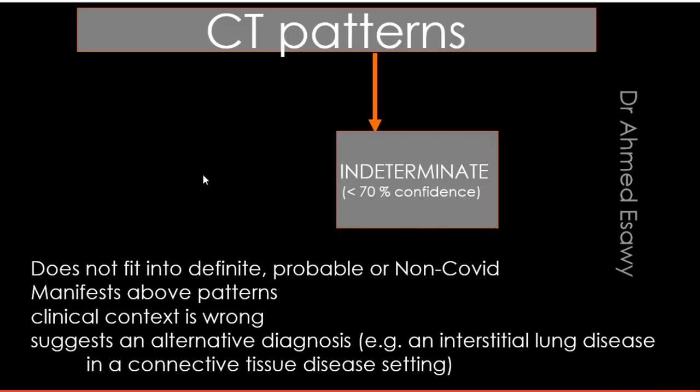Indeterminate CT pattern of COVID-19 infection, less than 70% confidence. This pattern does not fit into definite, probable, or non-COVID; it manifests the above patterns, but the clinical context is wrong and suggests an alternative diagnosis of interstitial lung disease or connective tissue disease of the lung.